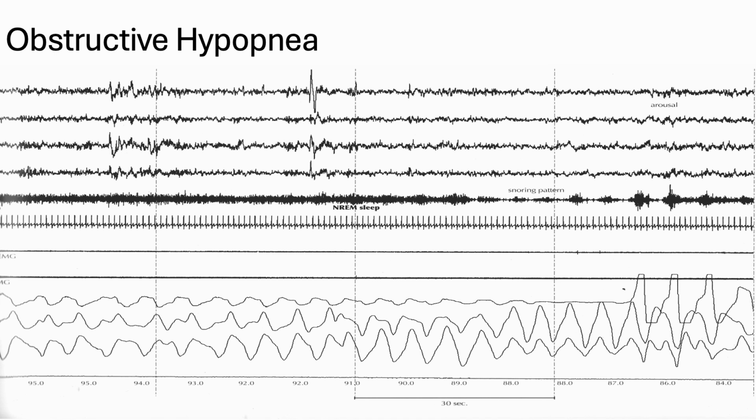Same thing with the chin tone. Have you ever heard of progressive relaxation? That's where you try and relax every muscle in your body, starting from your head going down. If you consider all the muscles around your lips and chin and jaw, it's tough to naturally relax them. But if you learn how to flex those muscles for a few seconds and then let go, that's what it feels like to relax them. Making a firm chin with these electrodes makes it look big, like a big black line. So if you think about how all these sensors work, you can figure out what you're looking at.